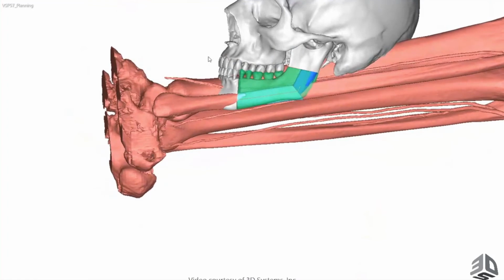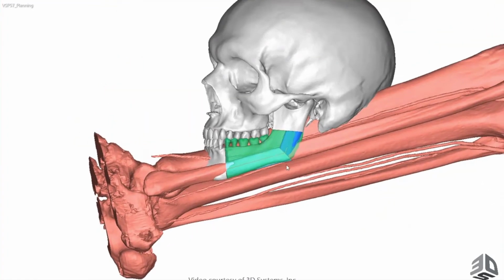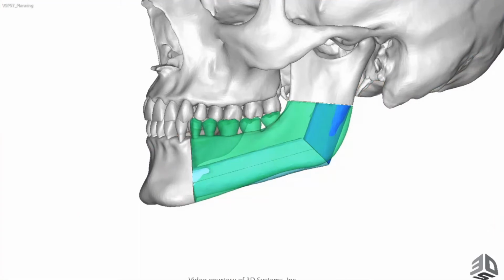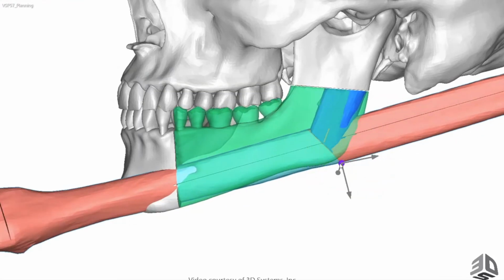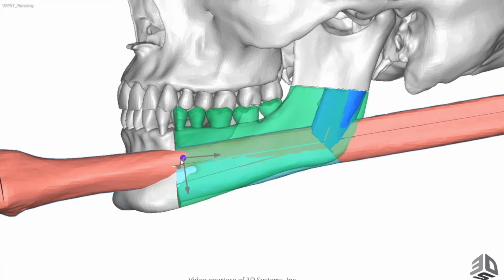There are a couple of technical tricks that you can try if you wanted to dentally rehabilitate these patients. If we can just quickly demonstrate that little technique, James, and then I'm happy to proceed with this as my final plan, please. Okay. So what you can do is lift that anterior segment up a little bit, so that it comes up to probably about 0.5 centimeter higher, that anterior segment, and that's it, perfect. A little bit probably lower than that.